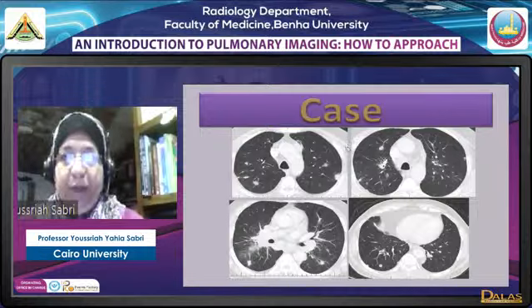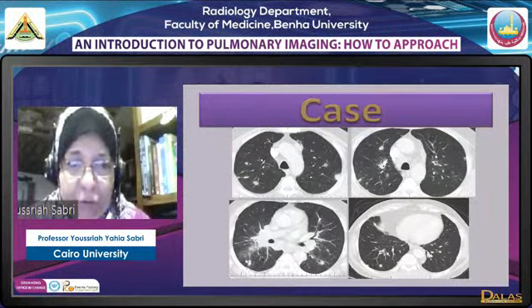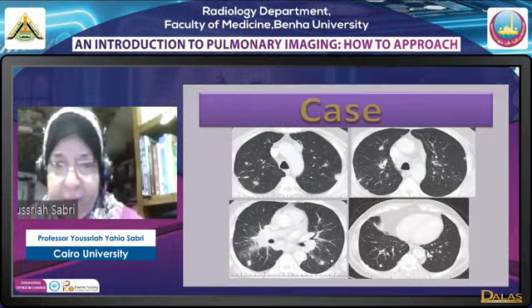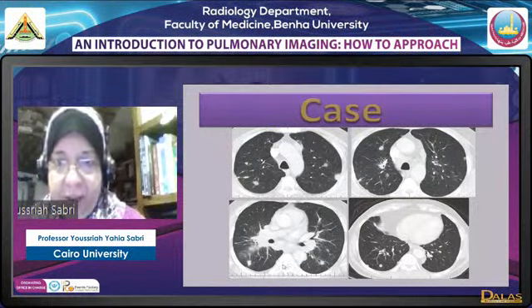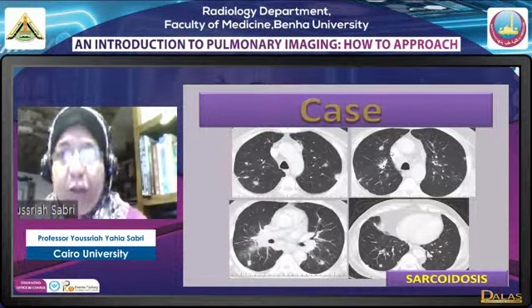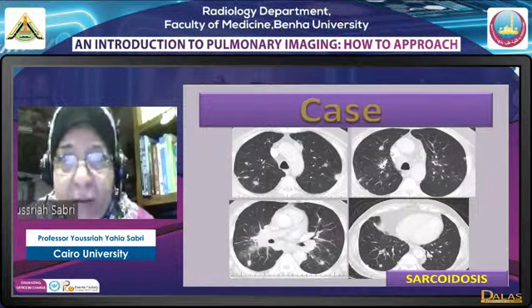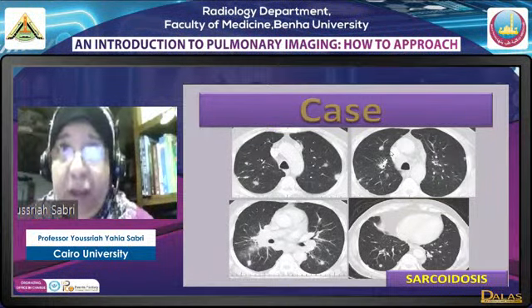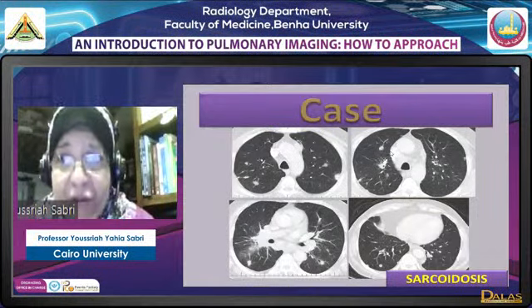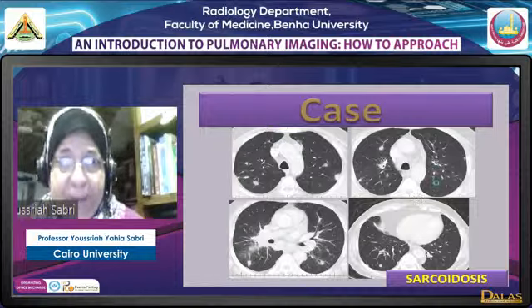We're going to have another change in morphology. Instead of the well definition of the lesions, we have nodules which are rather irregular and some of them ill-defined. This is a case of sarcoid. In addition, we have perihilar opacities and hilar fullness. So when we have nodules that are not sharply demarcated, we will consider the possibility of inflammatory or infection, and we will not consider metastasis mostly.